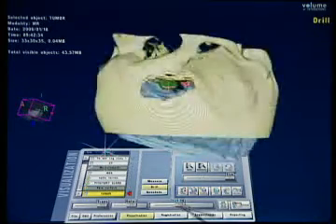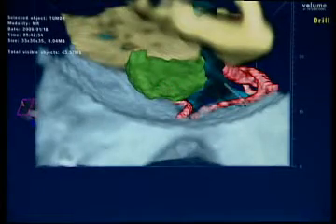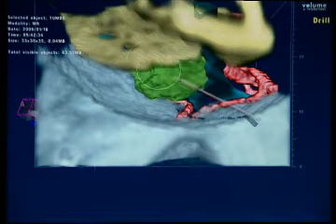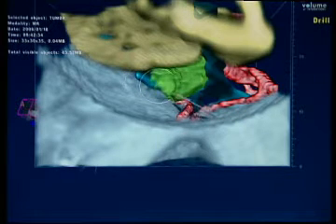So, again, this is the lesion. And what do I see? I see the right optic nerve. I see the ICA. And now let's start removing this guy. We started to remove at the planum. And then coming towards the tuberculum there. So with this line of sight, you can pretty conveniently remove all that.